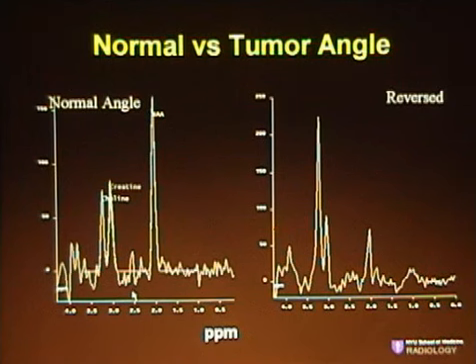Each of the metabolites will resonate at a different frequency shift depending on how many methyl components there are in the metabolite. And this will tell you the location of the metabolite in relation to the other metabolites. So all the horizontal axis is really showing you is the location of the metabolite.